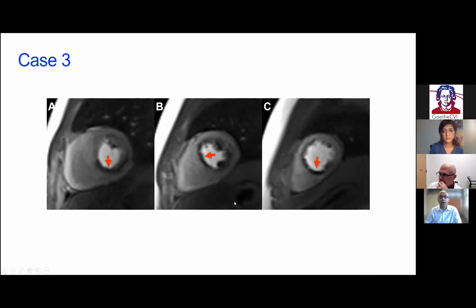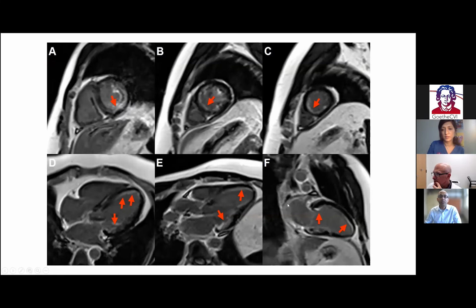And so knowing the coronary anatomy, again, this did not quite fit into ischemic coronary artery disease. And the answer lay in the late gadolinium enhancement images. And again, these are short axis images, base, mid, and apex, and the 4, 3, and 2-chamber images.